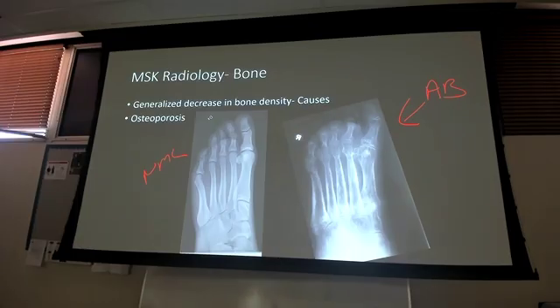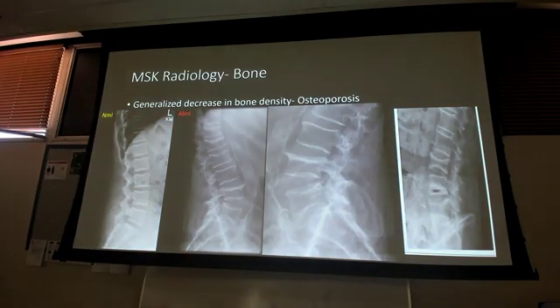Okay, so look at my spine, all right, look at my normal. And this is where comparing normal to abnormal is going to help you when you're looking at stuff. I want you to see a couple of things. One, the first thing I want to see is these nice, beautiful, shaped, straight vertebrae. Okay, that's step one. Two, my densities all kind of look the same inside my vertebrae, and this nice grayish, smooth area when I'm taking a look at them.